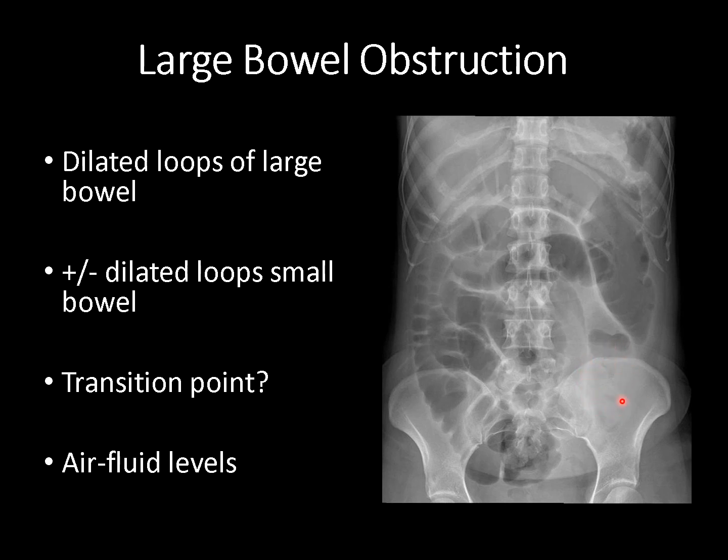So we can be quite confident based on this x-ray that there's a large bowel obstruction somewhere in the left lower quadrant here. We can't tell what the etiology is based on an x-ray, but we know where we're looking when we do the CT for this patient because we're expecting to find the obstruction somewhere in here, regardless of what the cause is.